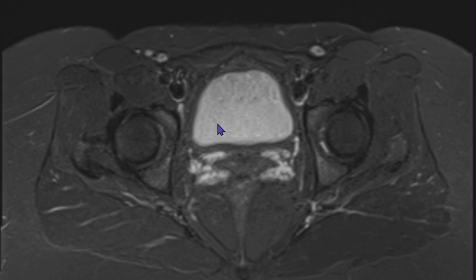In today's case, we will be looking over a case of a right-sided hip joint pain in a 20-year-old female. The patient had been complaining of hip joint pain since the last 1 month, for which the patient had been referred for the MRI. So we'll go through this MRI.